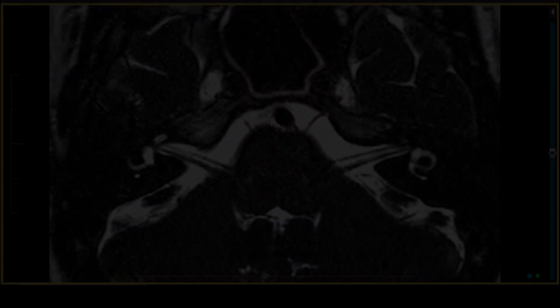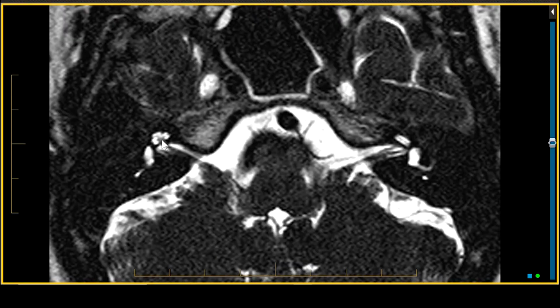I want to finish up our discussion of the cochlear vestibular or 8th nerve by starting with the cochlea. The nerve comes away from the cochlea. There's the modiolus of the cochlea. There's the spiral lamina, and the high signal intensity represents the components of endolymph and perilymph in the otic capsule. Now, the spiral ganglia are where the nerve starts.